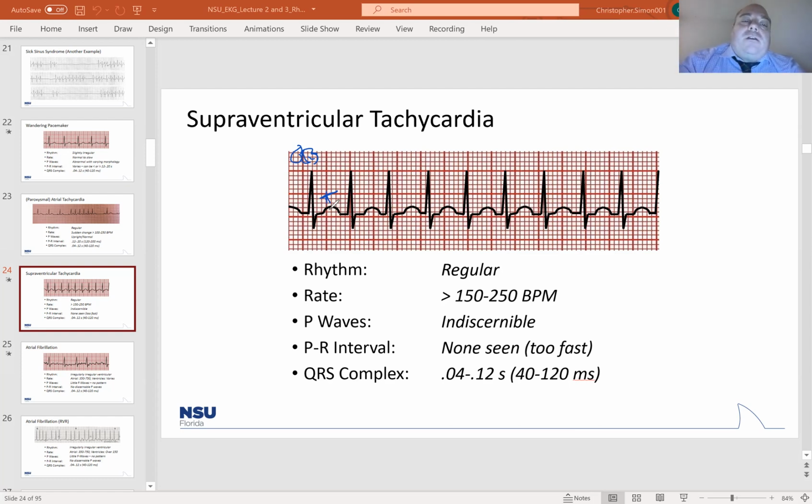So what do we got? We got a QRS, a T, QRS, a T, QRS, T, and it just kind of repeats like that. Okay. So interesting. We don't have some P waves. So I'll tell you what we can do. Let's find out what the rate is. I'm going to pull my calculator out because I don't know.